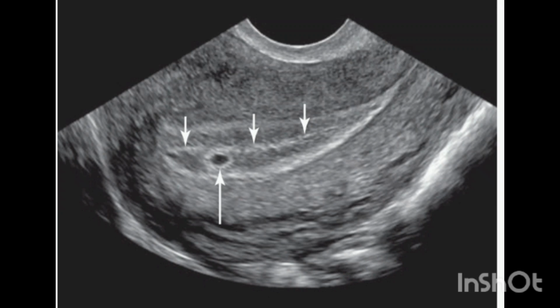In today's session, I will be talking about early pregnancy ultrasounds, specifically targeting the key anatomical structures visible in the first few weeks. In this video, we'll examine the early gestational sac, yolk sac, the early embryo, and discuss their clinical significance in confirming pregnancy, viability, and development. Let's dive into the ultrasound findings.